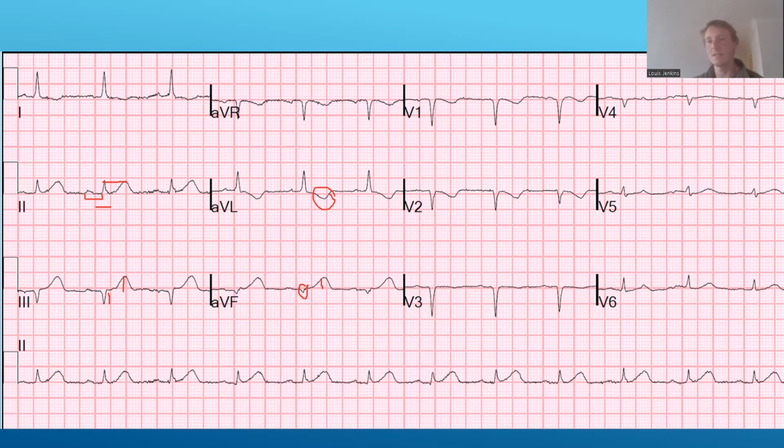Okay. Now there are some ratios that get thrown around on the internet that have been proposed to quantify this a little bit. But one of the difficulties with this type of patient is that there's no expert consensus on how a hyperacute T wave should be defined. Which makes it really difficult to diagnose MI in this sense. But there are some cardiologists out there who would consider this ECG to be diagnostically equivalent to a patient having a STEMI. I wouldn't be so brash personally. I think this is really concerning. I think this is suggestive. I'd probably want to see a few more changes before I commit to the diagnosis of STEMI in this patient, but I can totally understand where they're coming from.